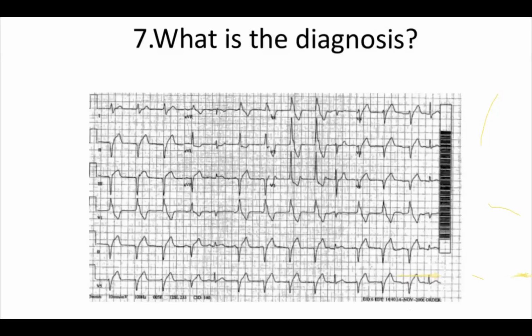What do we call the sinus beat? We call it a capture beat. And the beat before, we call a fusion beat. What are the capture beat and fusion beat? What is the physiology of this beat? In a capture beat, even when tachycardia happens, the normal system still functions. The only thing is the ventricular rhythm overtakes it, right?